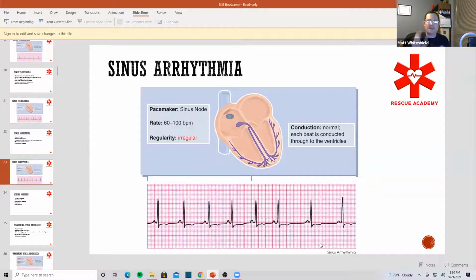There's an irregular beat with regards to the ventricular contractions that are occurring, these QRS complexes. Now, you might look at this and say, well, hold up, Mike, wouldn't that be considered AFib? Well, no, remember the atrium for AFib, you're gonna see quivering in between each R wave, right? This is pretty damn stable. And the only reason why I'm saying that this is not a premature contraction is once you print it out, there's going to be a lot of irregularities going throughout this EKG.